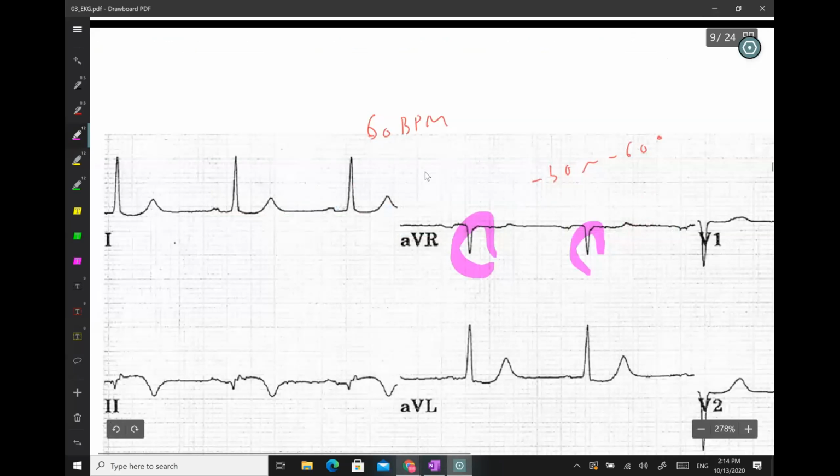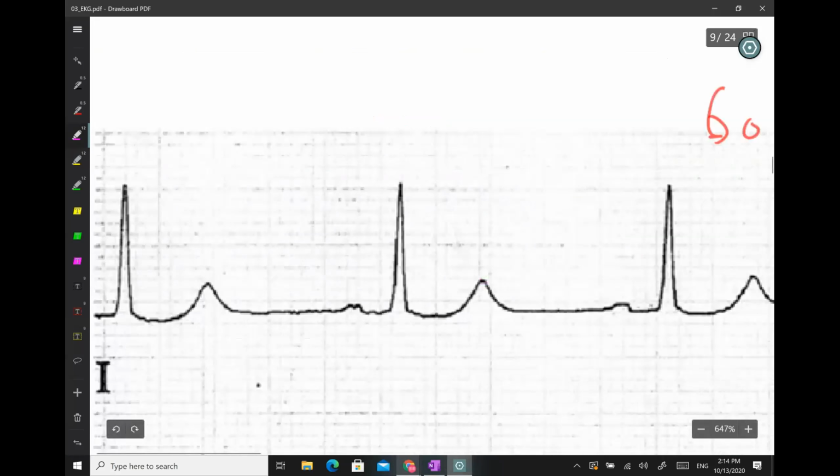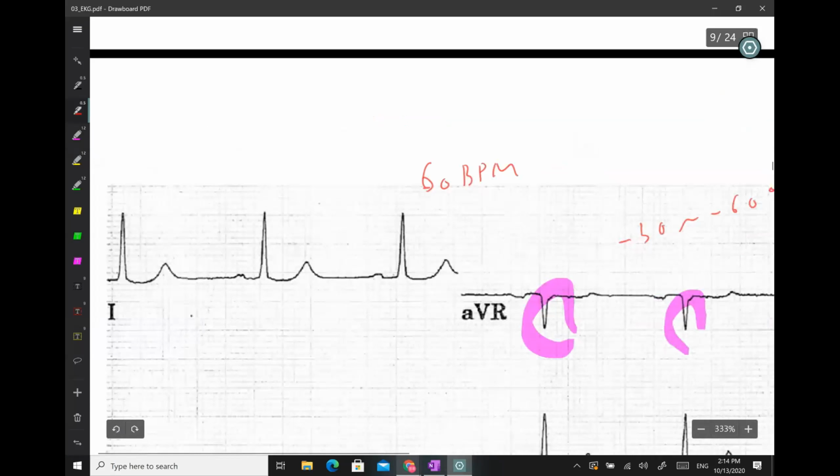Okay, now, if you look at, let's leave the screen here. In lead number 1, let's see the P wave, the first P that you can see here, that's notched. Can you see this notching in the P wave? Is it notched? Yes, a little bit notched. So a notched P could indicate a P mitrale or left atrial hypertrophy. It's not for sure because it's not so wide, but you can mention that because the P is notched, it's possible this patient has a left atrial hypertrophy.